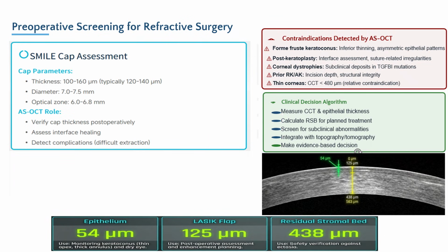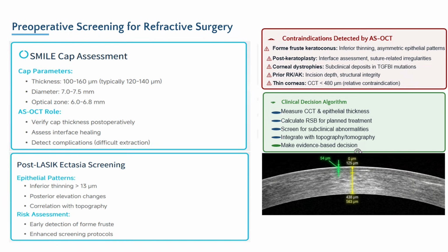Now, another assessment apart from the LASIK and the flap, we come to the cap that's done during the SMILE procedure. The same thing, we have to assess the patients to determine the thickness, how much amount we are willing to remove, and the diameter and everything related to the SMILE procedure, and find out any red flags for this procedure.